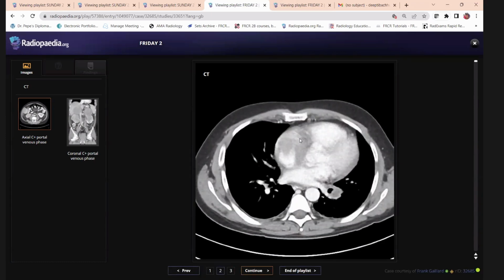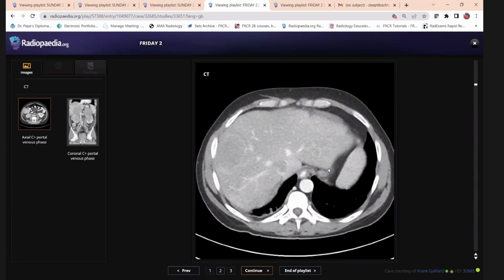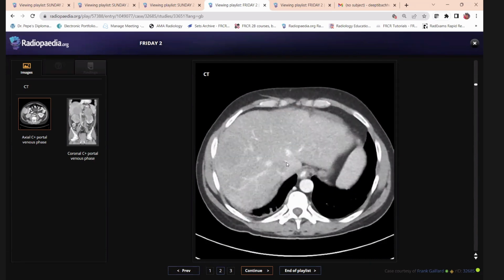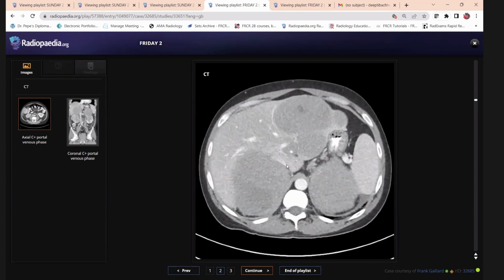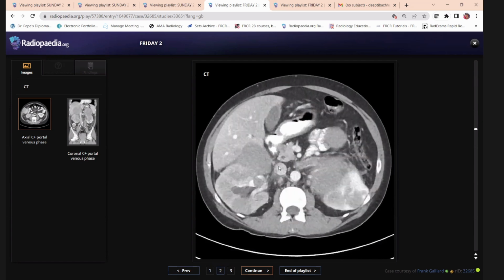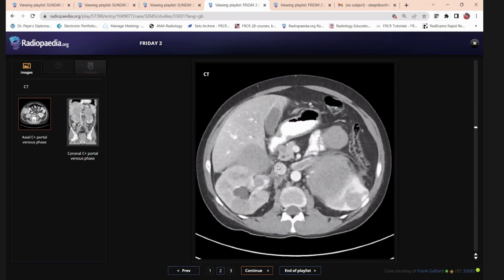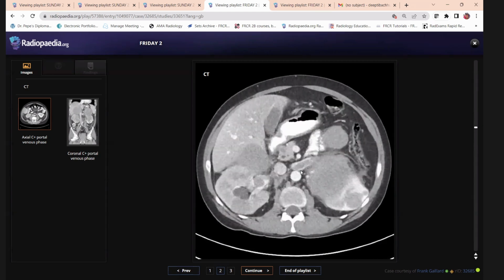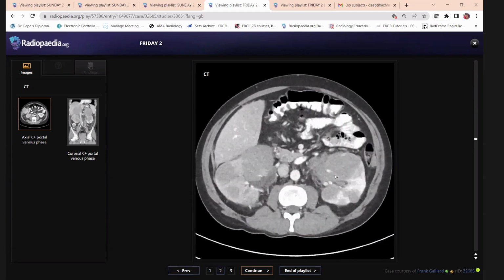There is, I think, a filling defect in the pulmonary artery, the left lower pulmonary artery. I'll urgently alert the referring physician about this finding, and I continue scanning the study. There is a filling defect also within the IVC. There is a large soft tissue mass lesion seen in the renal/suprarenal area. When I finish the study, I'd like to see the coronal images to localize this. However, there is another lesion.